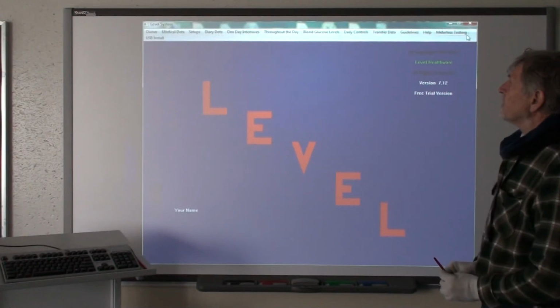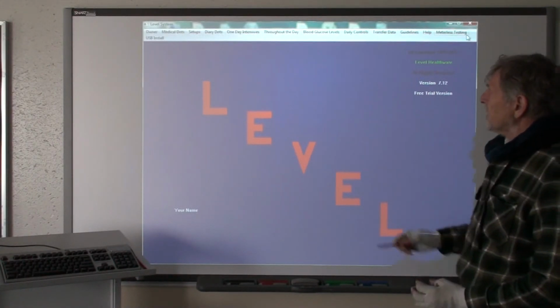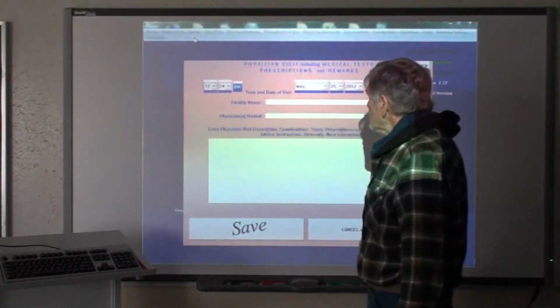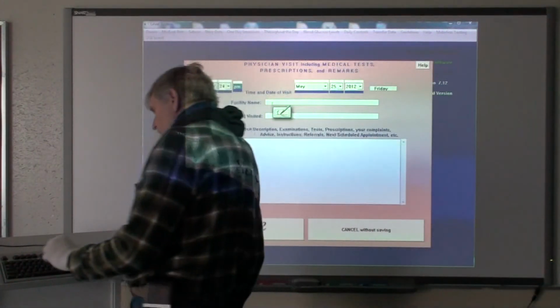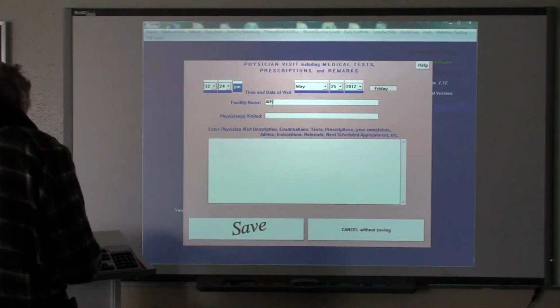And suppose that what you want to do is also record a visit that you made to your physician. So let's record a visit to your physician that you made today. Suppose the facility name that you went to is Airport Hospital.